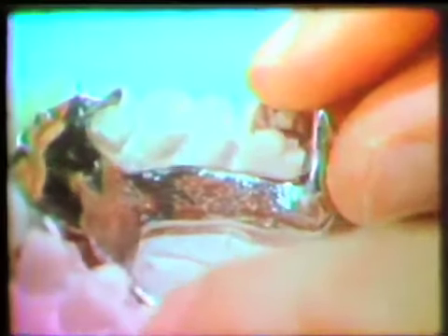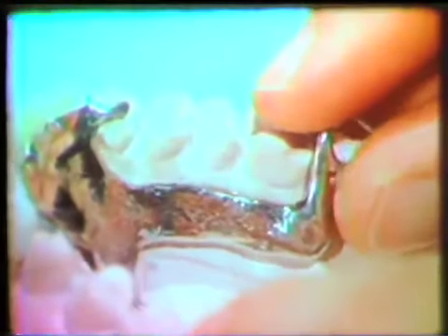The completed cast partial denture is now being seated on the cast. Notice that the anterior segment is positioned first. Then the molar clasps are rotated into place. Such a partial denture with an all-cast anterior segment will generally prevent breakage of the teeth or the plastic base.